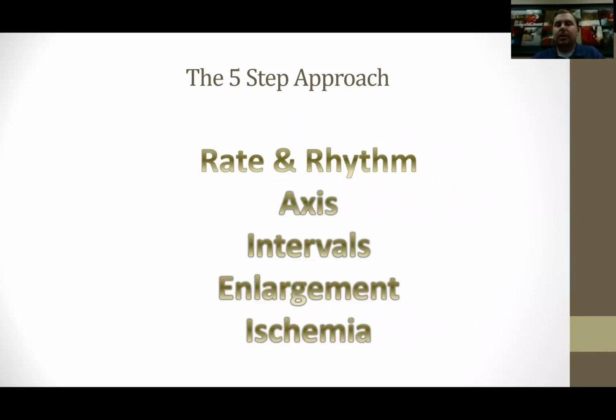They get to the hospital, and the doctor looks at it and says, no, this wasn't a STEMI, it's a left bundle branch block. If you go in this order, you should identify that stuff beforehand, and then know once you get to the elevation or depression measurement that, hey, I have left bundle branch block. Then I understand why those are already on there.